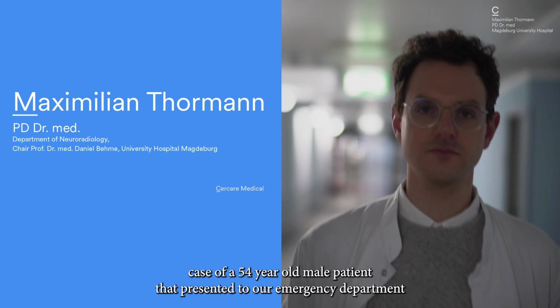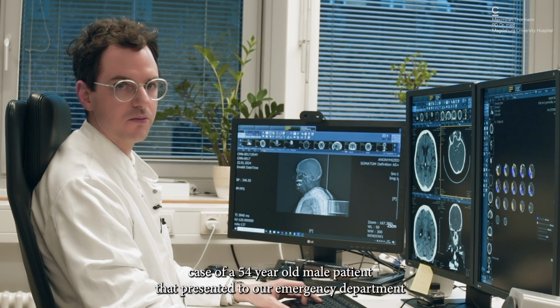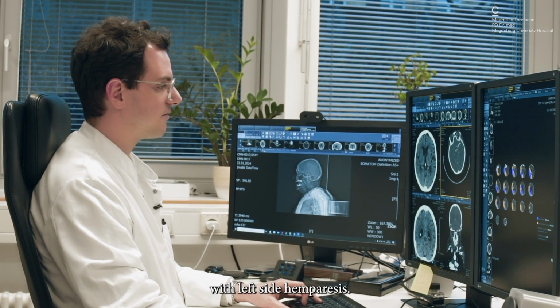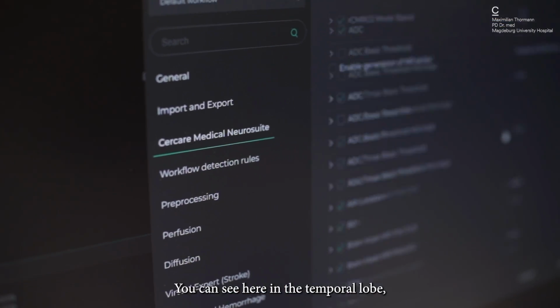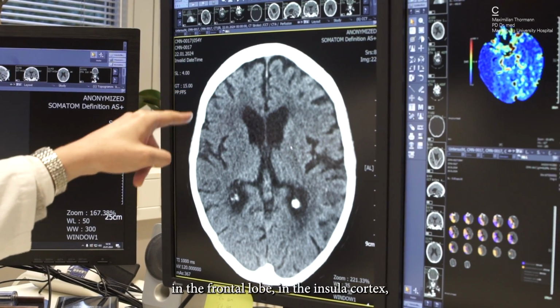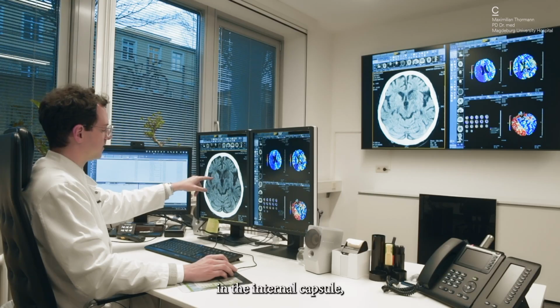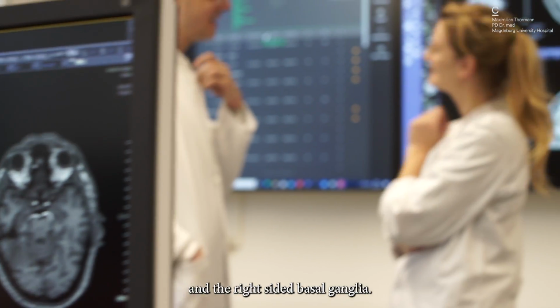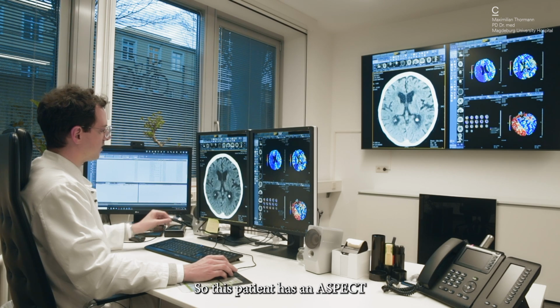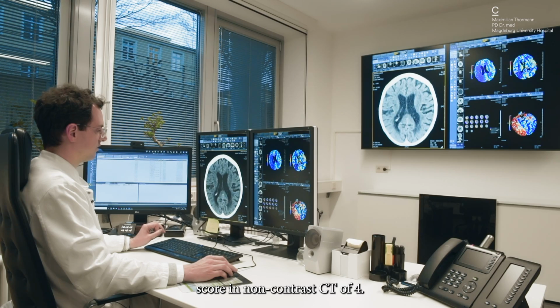I present to you the case of a 54-year-old male patient that presented to our emergency department with left-sided hemiparesis. You can see here in the temporal lobe, in the frontal lobe, in the insular cortex, in the internal capsule, and the right-sided basal ganglia. So this patient has an ASPECTS score in non-contrast CT of 4.